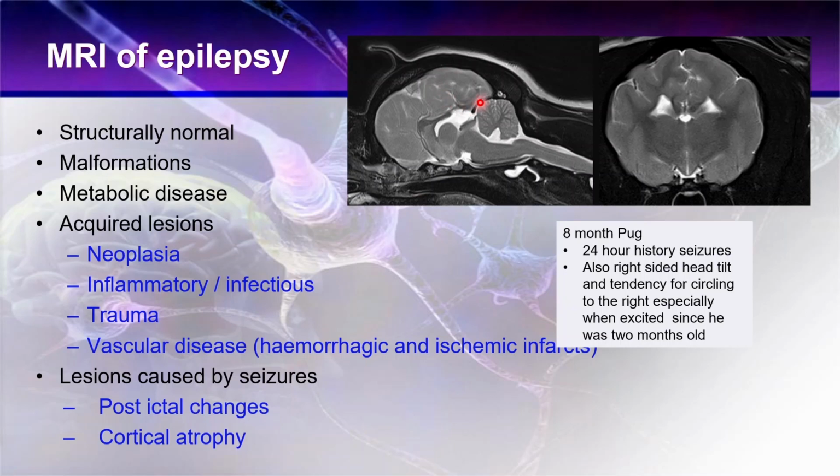And when that happens, white matter tends to go off in all directions and form little bits of circuits. So we can see here that it's not entirely symmetrical through this region. It's not got the same folds on one side as on the other. And when you're comparing MRI scans, it's important to look at the symmetry going from side to side. And certainly this is not symmetrical, so it looks like there's some cortical dysplasia going on up in this region. And even in this region, the white matter doesn't look the same as in this region.